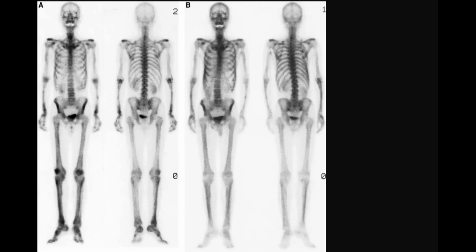So I will check the clinical history of the patient, how the patient is presented. Are you sure, boss, it's metabolic bone disease? It can be metastatic, but I will check the clinical history of the patient, if the patient had known metastatic. Okay, no problem. Revise after me, no problem.